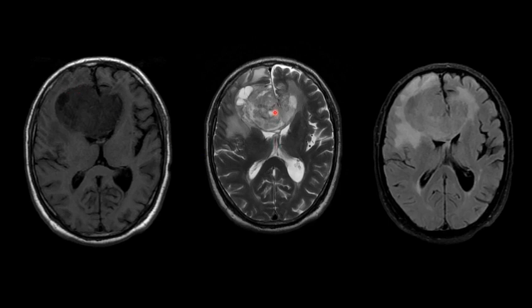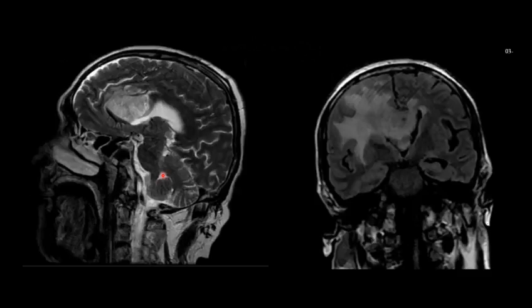This lesion is heterogeneously hyperintense on T2 with few cystic spaces noted, and it is iso to hyperintense on FLAIR with significant perilesional edema noted. This is a sagittal T2 weighted MR image showing the lesion involving the genu and proximal body of corpus callosum, causing inferior displacement of lateral ventricles. And on coronal FLAIR image, we can see the lesion is involving the genu of corpus callosum and extending into the white matter of bilateral frontal regions with significant perilesional edema noted on the right frontal region.